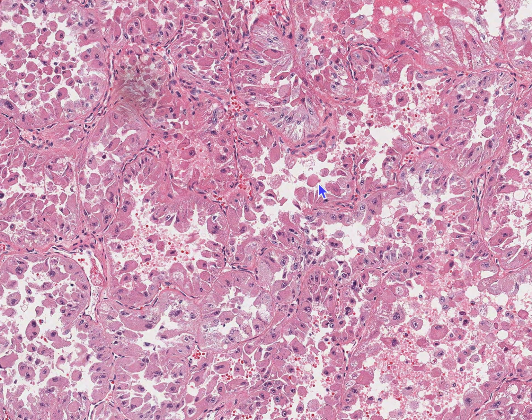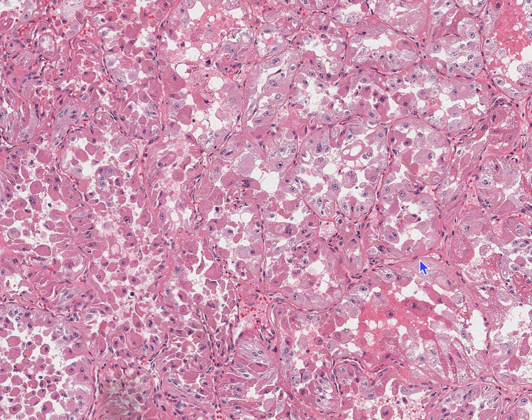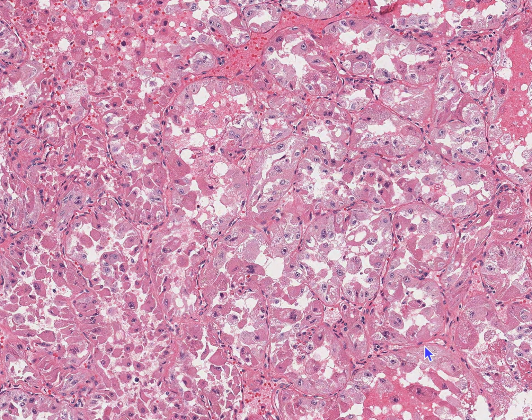You also can think of embryonal rhabdomyosarcoma or alveolar rhabdomyosarcoma, but that will be more blue. It was that small round blue cell differential. You can also think of PEComas, paragangliomas, granular cell tumor, and metastatic adrenal cortical carcinoma.